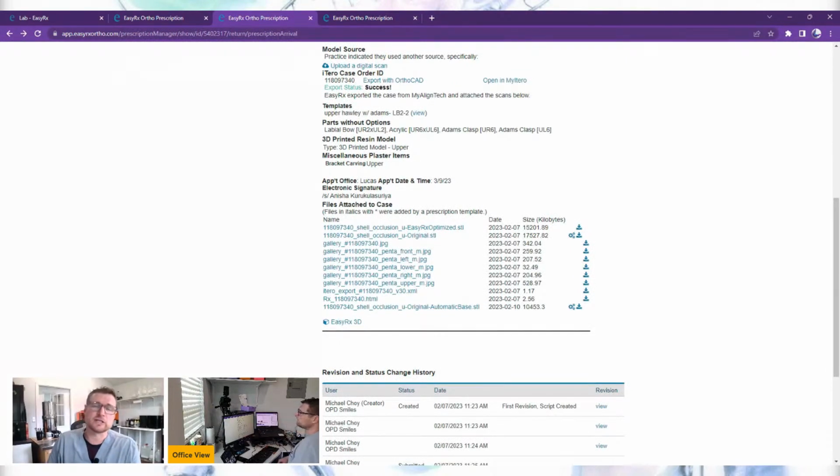My wife actually checks those in, sends them to the auto base, and then puts them on my shelf. And then when I'm ready to print, I have another screen here. I'm going to need to refresh this.